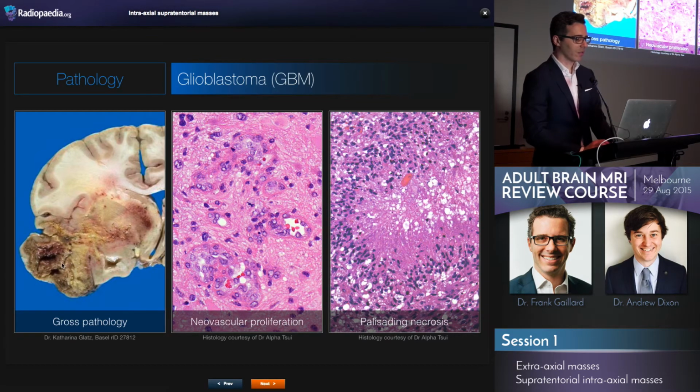The end result, though, is a very heterogeneous, ugly tumour, broad zone of transition, areas of hemorrhage, areas of necrosis. And when you see an enhancing lump with a central area of non-enhancement, with all peripheral heterogeneous enhancement around the margin, you can almost be certain that this patient is going to die of a high-grade glioma, regardless of what the histology tells you. And if the histology tells you it's a grade 2, most likely they've undergraded it.